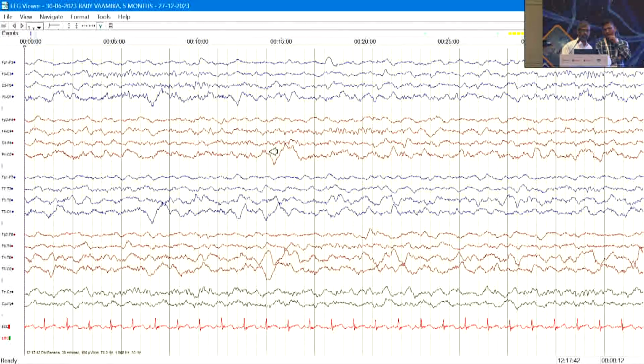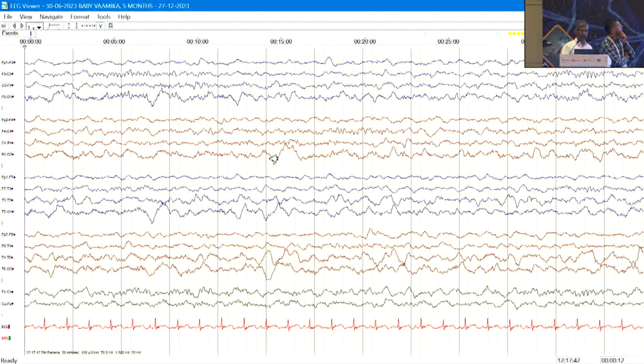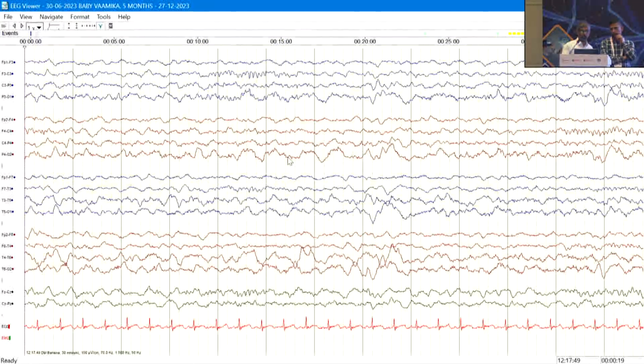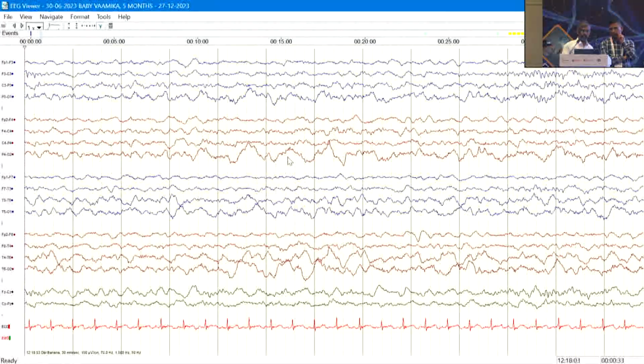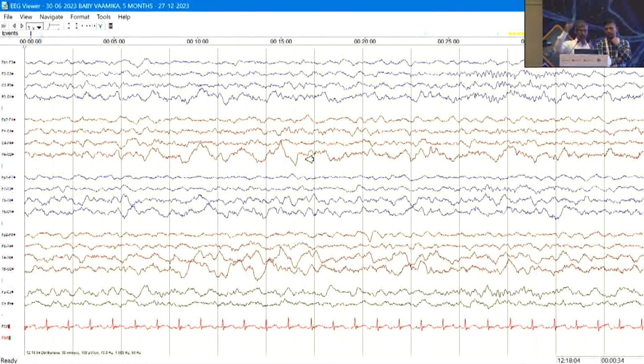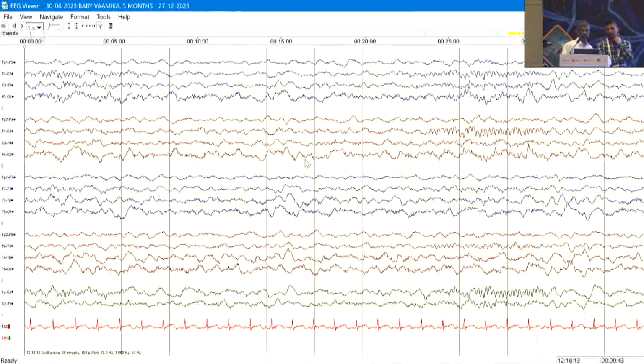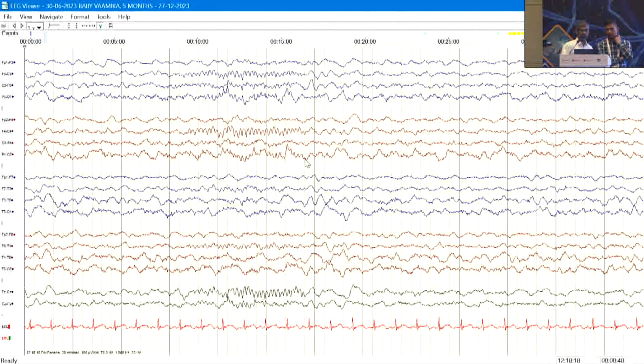And here, what do you see in between? This is a sharp delta activity in the occipital region with a negative polarity. So this is the cone wave. This is the earliest age that you can see some cone waves, and usually the posterior delta activity is of higher amplitude. These posterior delta activities are higher amplitude all throughout young infancy and childhood. So this should not be taken as occipital slowing. In a sleep EEG, occipital delta activities are higher amplitude, which is normal for infants and young children in sleep. So this is a very normal finding. Many times this is reported erroneously as abnormal.